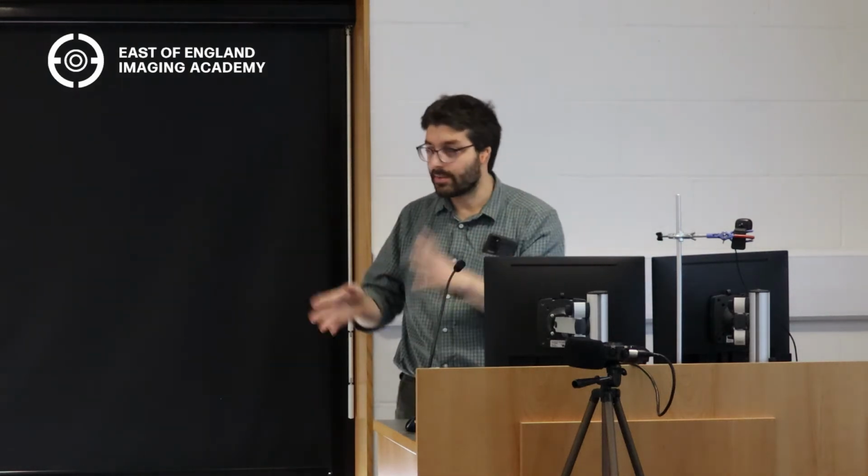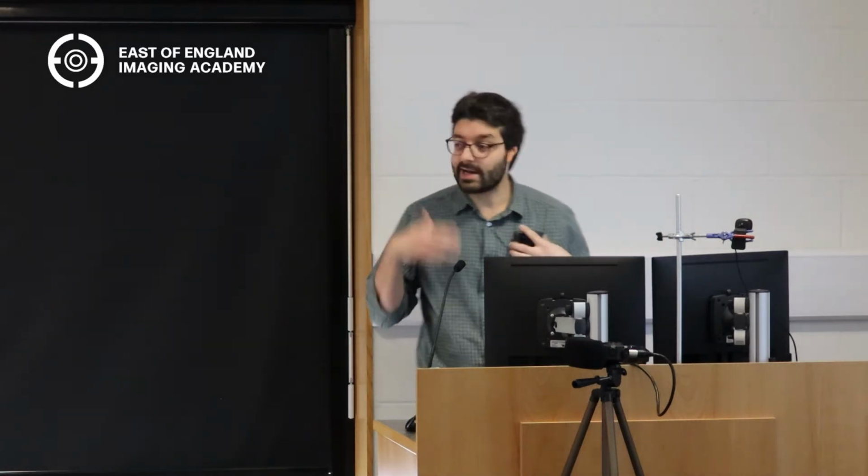Part number one, appendicitis. So already, without even finding the appendix, you're thinking, right, I'm thinking appendicitis. I'm thinking Crohn's disease. I'm thinking right-sided diverticulitis, maybe, or some sort of right-sided colitis, or something like that, right? So already your mind is working. This is what you've got to be like as a radiologist. You're already thinking, okay, this is my differential diagnosis. Let me narrow it down further, right?